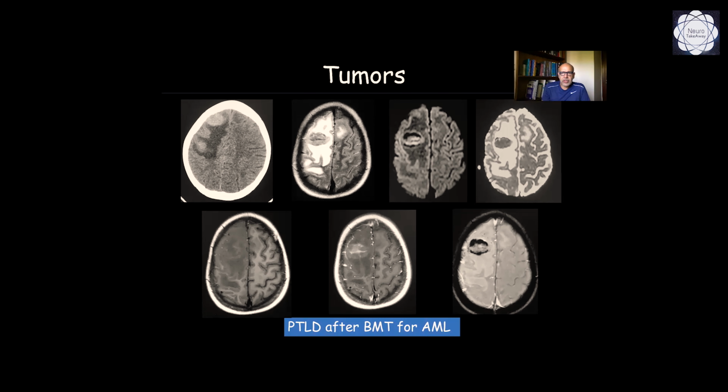We had the opportunity to see this boy who developed a focal lesion with high density on CT, restriction on MR, edema, and hemorrhage, which we find in some patients with this complication. And these lymphomas develop in association with an Epstein-Barr virus infection.